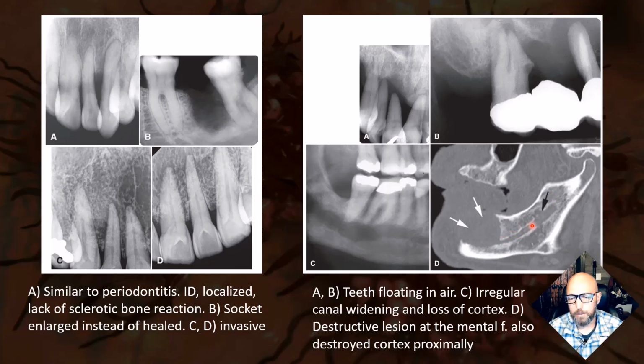We see proximal up the canal along the superior border, so closer to the origin of that canal, is this irregular, still well defined, but irregular erosion along the superior border. And this is perineural spread, showing that, okay, what likes to do perineural spread? Malignancies. And so bad signs in this case, even though some of it looks well defined and might make you first start thinking it's a benign thing, look for these other signs.